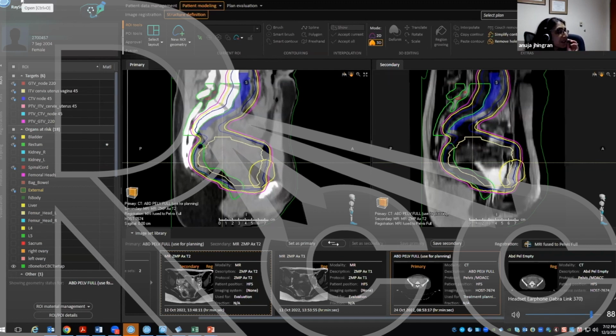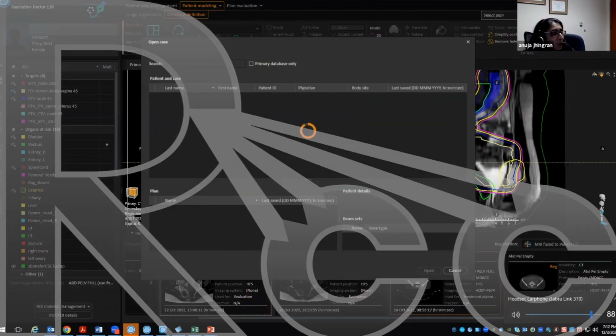Any questions about this? And then I'm going to show you the next case where the uterus does not change with the bladder filling as well. I mean, there's a lot of cases where the uterus really does not change with bladder filling. So give me 1 second. I'm going to pull it up. It just takes a minute for all these to work. So while I'm pulling it up, does anybody have any questions about that? Because I do think it's an interesting case. It's something that you will see, and that's why I brought it up for multiple reasons.